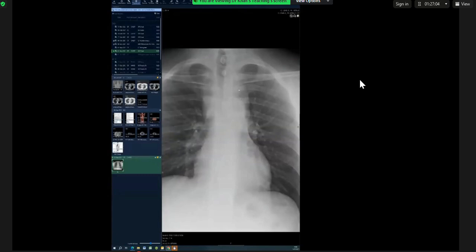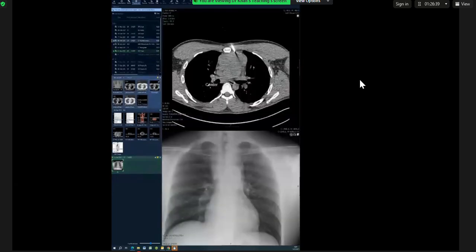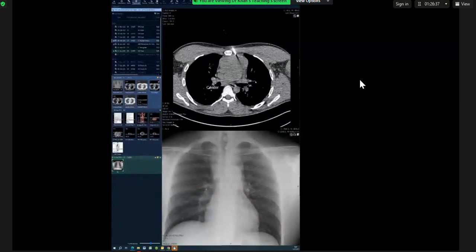But this one, you said widening of the superior mediastinum. You did not say it was smooth contours. You did not say it extended up into the cervical region or not. You did not offer the silhouette sign. You didn't talk about the aorta till the end. But you got it right, but you didn't maximize your marks for some reason, even though the knowledge was all there. When you've picked a superior mediastinal mass, you have to say all the terrible T's.